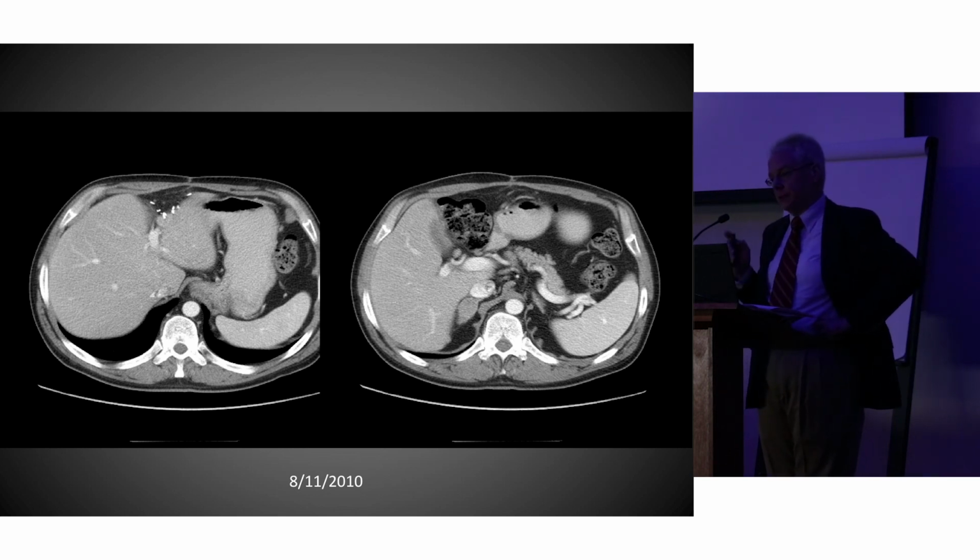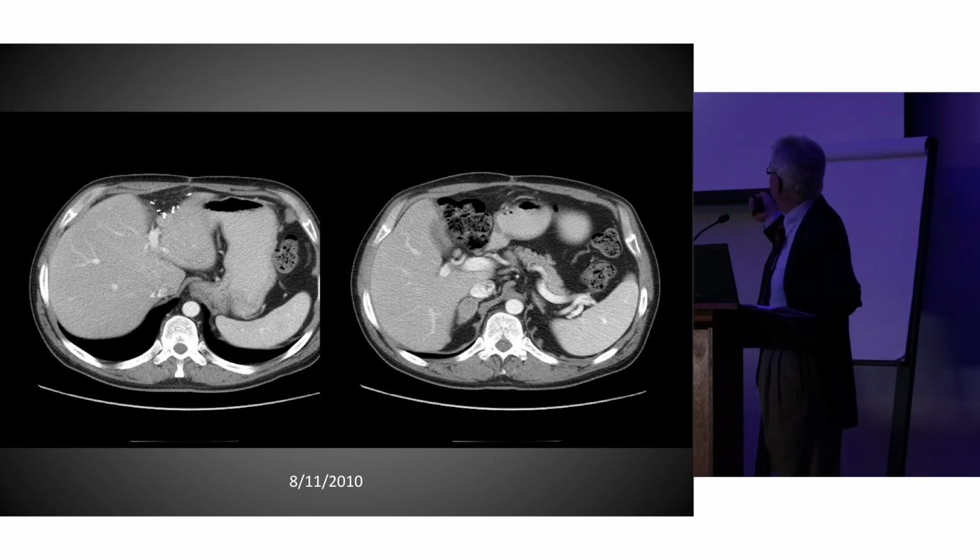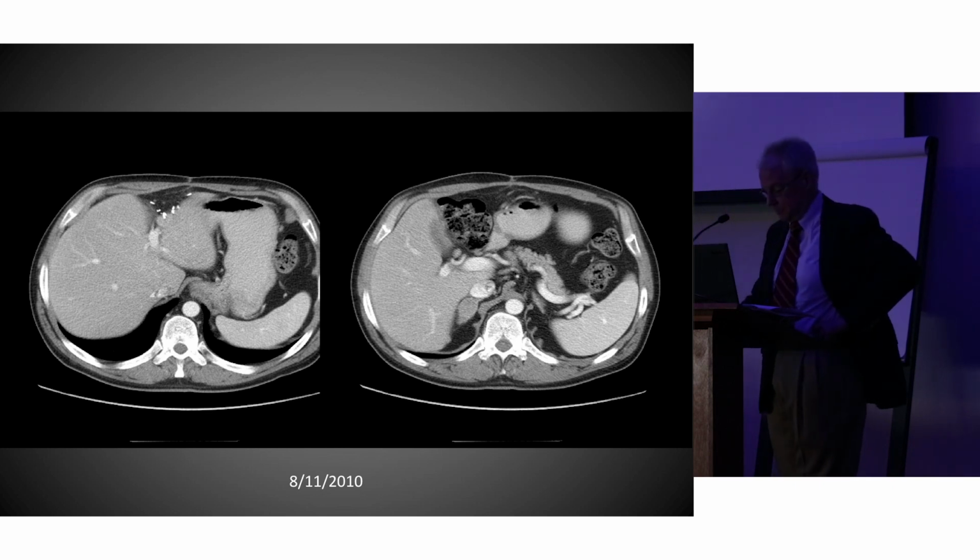This is jumping back to a CT scan for a moment, but notice the date, August. And look, this is a good quality CT. Here's the liver, here's the spine, here's the spleen, this is the stomach, this is the pancreas. The liver looks pretty good.